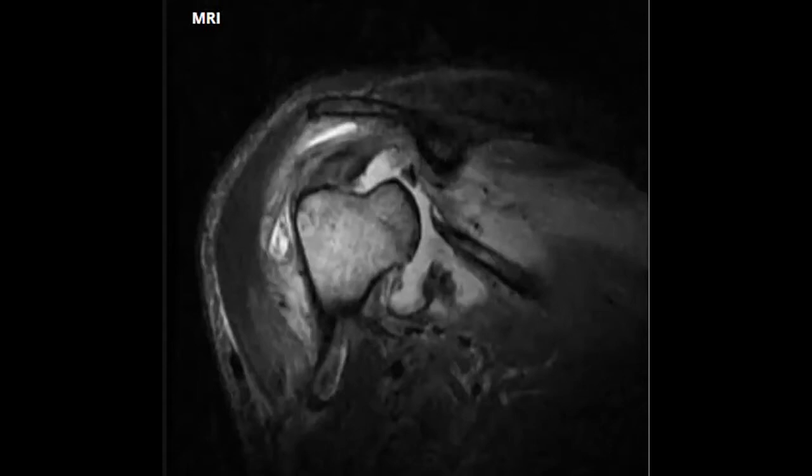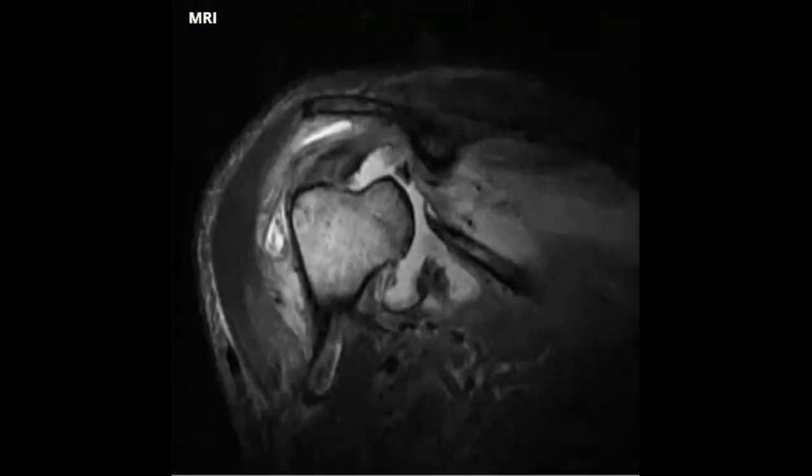Before I go to the next step, so a destructive process in the joint, the shoulder joint, erosive, yes. Differential diagnosis is better when you go with congenital, traumatic, inflammatory, neoplastic. This scheme can help you reach the best diagnosis. Okay, Charcot is a good differential. So when you think about Charcot, they like this in the exam. If you think about Charcot, then what will you ask as a next step, or what would you like the examiner to show you?